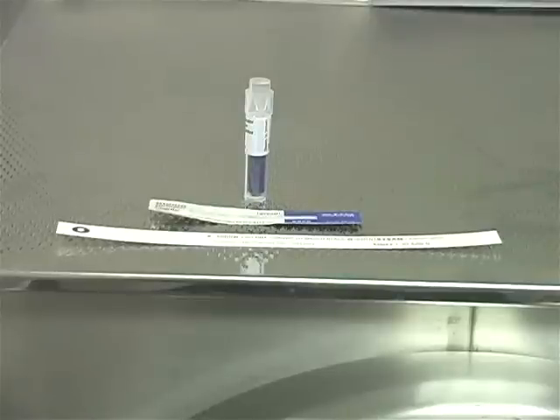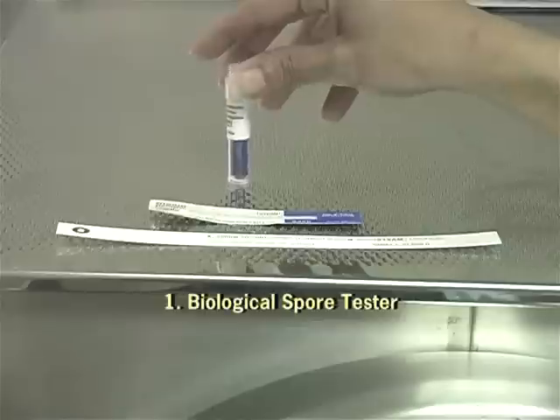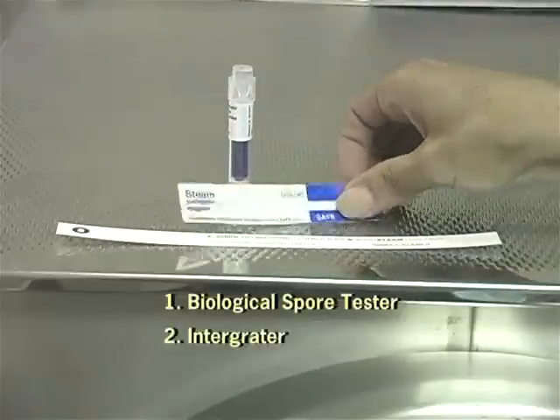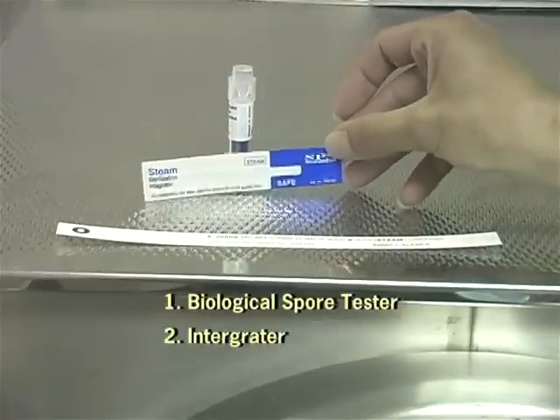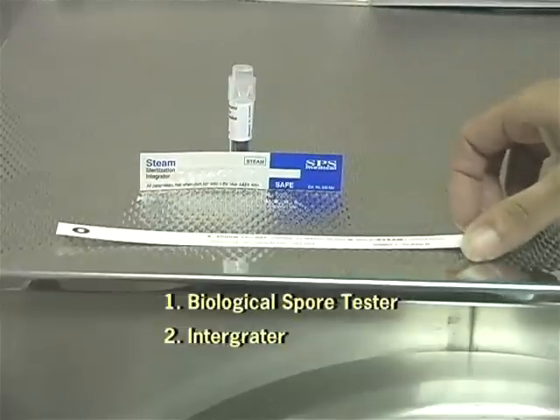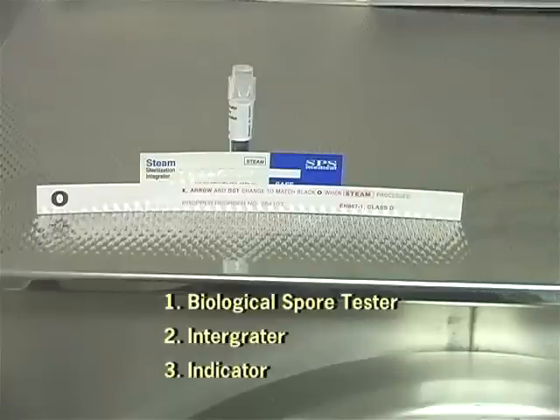Sterility of the instruments is achieved and monitored by several mechanisms. Joy, would you explain to us how that works? One thing we use is a biological spore tester that is used daily to monitor the sterilizer itself, an integrator that verifies that the steam and the temperature is achieved, and also an indicator inside each pack that shows that the steam penetrated and the sterilizer reached its temperature.